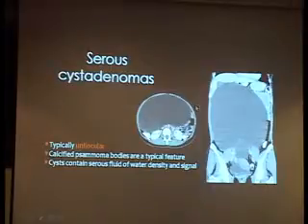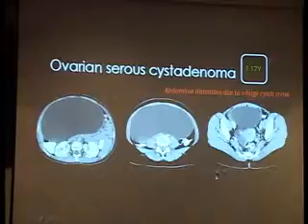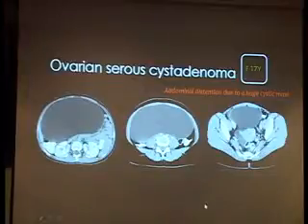And you can see this is serous cystadenoma, which is classically a single cavity, huge in the abdomen. It may reach this very, very big size. And inside this cyst, you cannot see calcification, you cannot see septations, you cannot see mural nodules, and sometimes it can be mistaken for a huge simple ovarian cyst.